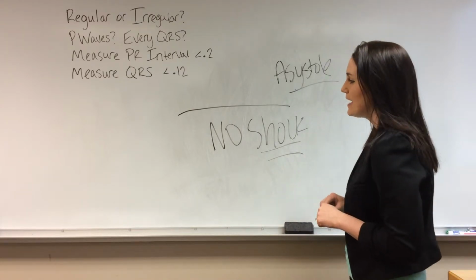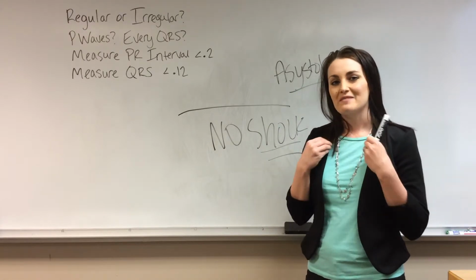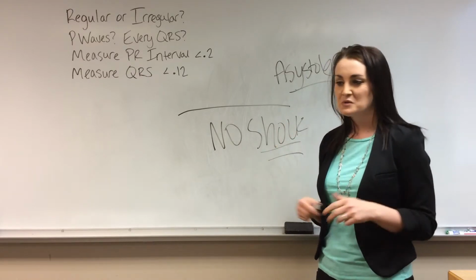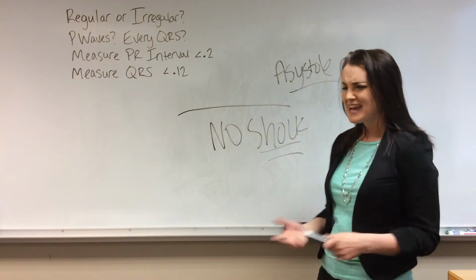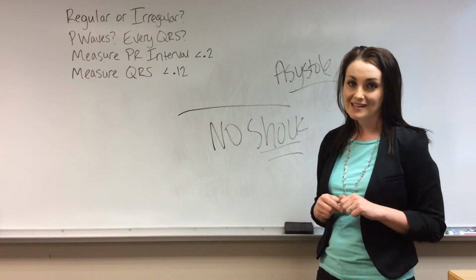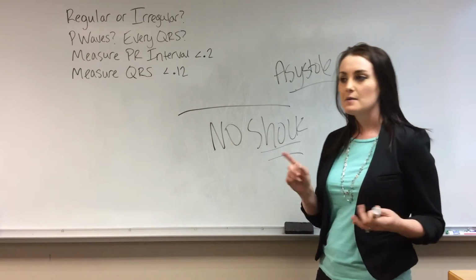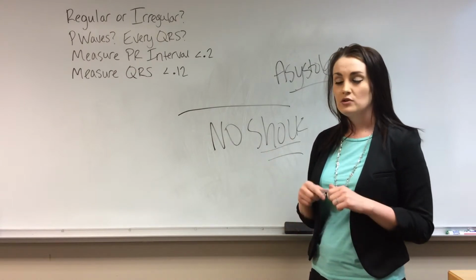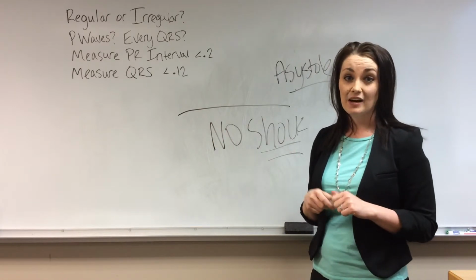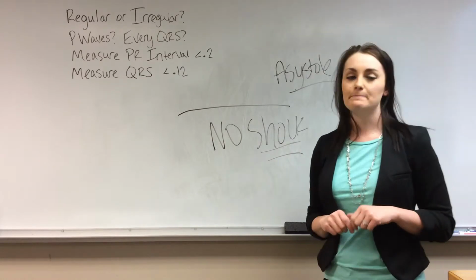And so, as it was taught to me when I started in cardiac ICU, they said if you put electrodes, cardiac monitoring leads, on a rock, it would be an asystole. That's what its cardiac rhythm would be. And so you can't shock a rock. There's nothing there. And essentially, that's what's going on with a heart that's in asystole. There's nothing to shock. So, no shock advised. CPR, meds, and then if it can turn into VFib then, hopefully, if we get a rhythm back, then you can shock it later on in the code. But right away, as long as you're in asystole, there's no shock.